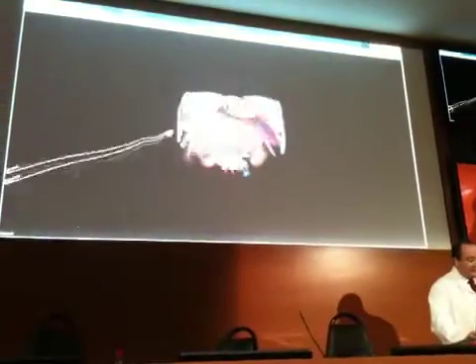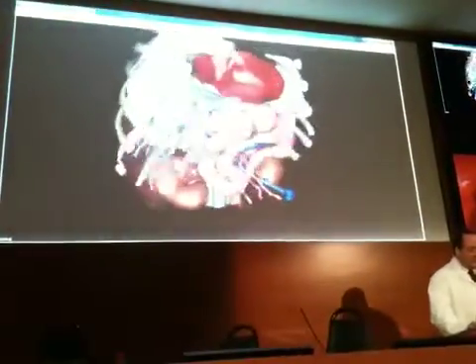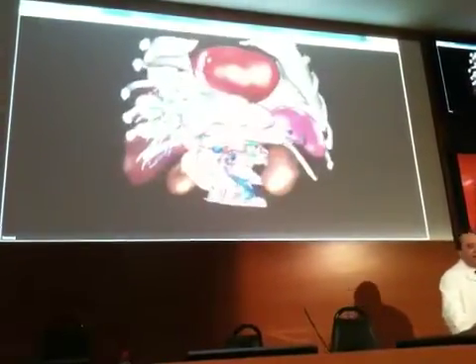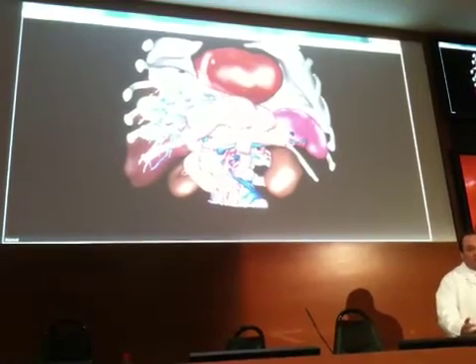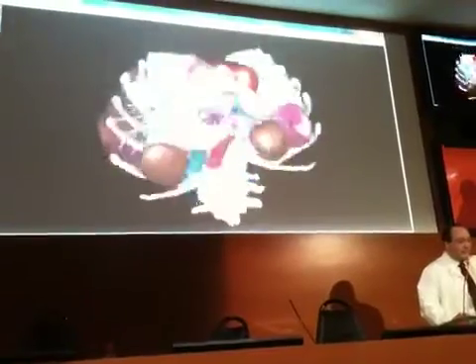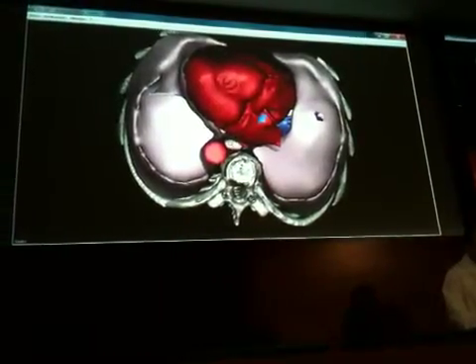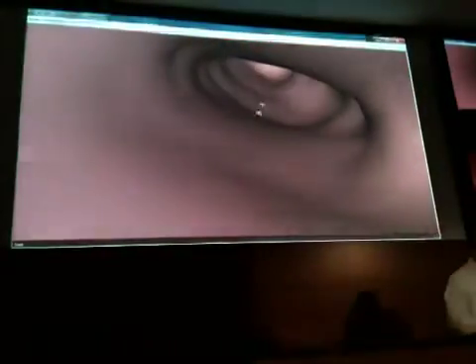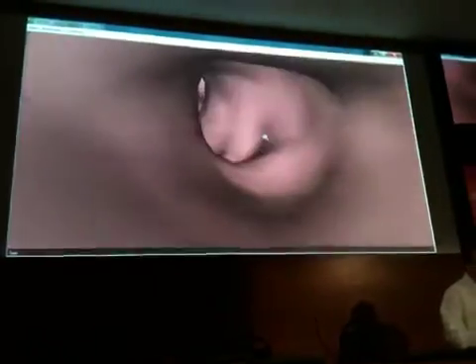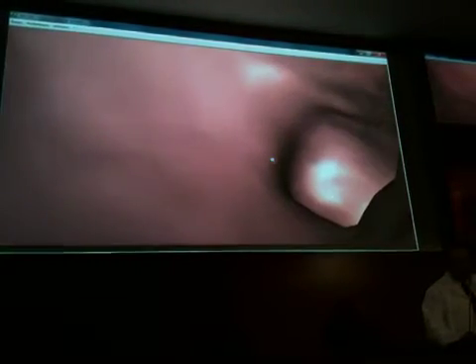So what we can do is clearly not a thermal ablation like that. I remove the needle. I can also plan if I want to do a transluminal surgery. Perhaps you have already heard about transluminal surgery during the course. You know that the problem of transluminal surgery is to know how to go outside from the organ. So here, if I go in the stomach from the esophagus, which is what you see now, I can navigate inside the stomach. And my problem is to know how to go outside of the stomach in the good position.